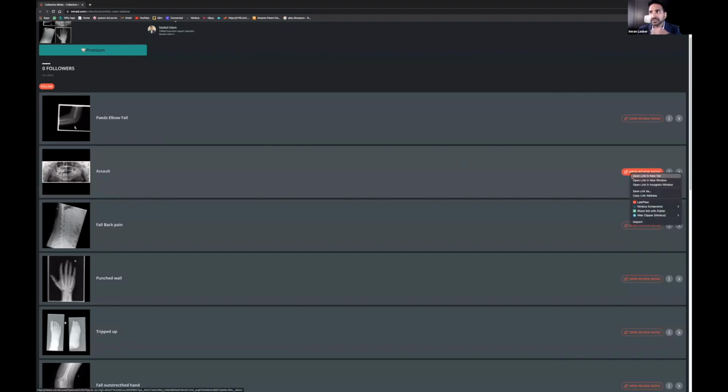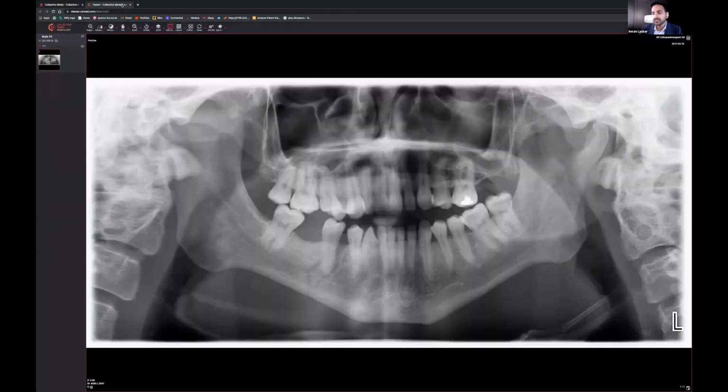So I haven't done these in any particular order, because when we're teaching our registrars, you're trying to get through a reporting pack, and it's quite good to be able to go through almost random cases. This is what I want to do: bring really cool cases forward, and hopefully through the community we may have some more cases offered for us to look at during these live sessions once a month. We can hopefully learn together and build a bit of a community with one another. So now we're looking at this particular mandible view.